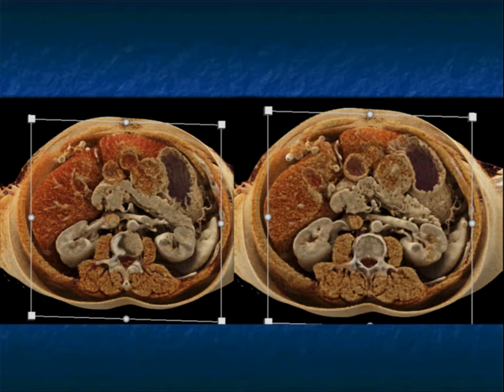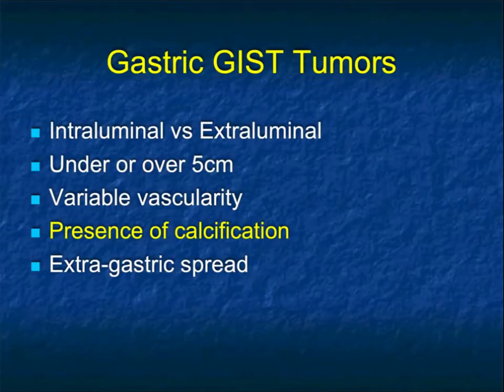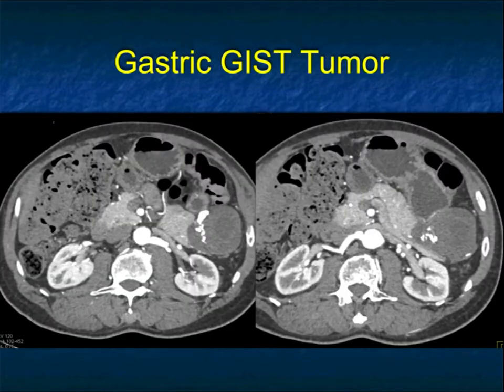I have to admit, I really like GIST tumors. We wrote an article, I think Steve Rowe and Linda Chu, on cinematic rendering of GIST tumors, and that can be very helpful in this regard. And again, just a range of images to show you. Now, one of the things people don't appreciate is GIST tumors can calcify.